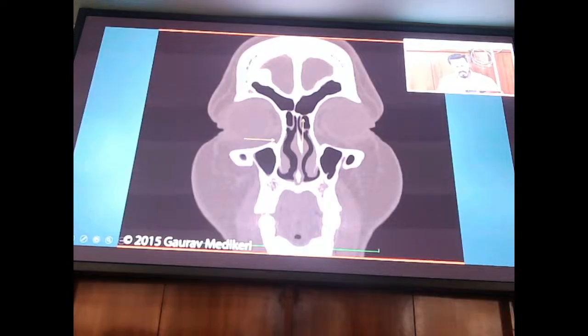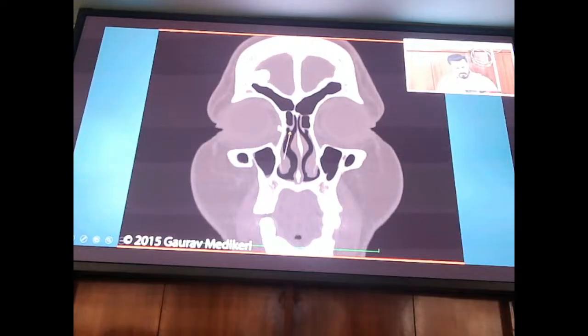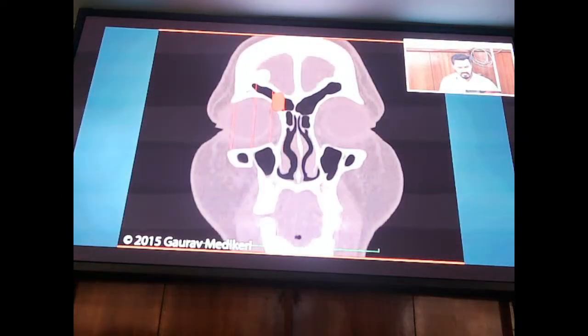Now this sac is starting to become a tube. You will start to see this tube here. I will show you in very good detail. And you can also start to see the appearance of the middle turbinate. Always remember that the agger nasi is anterior to the middle turbinate. So you will not see the middle turbinate before seeing the agger nasi, unless it's an extremely small agger nasi, in which case it might not be very well pneumatized, so it can appear behind the middle turbinate also. But in the majority of cases, it is before the middle turbinate that you will see the agger nasi.